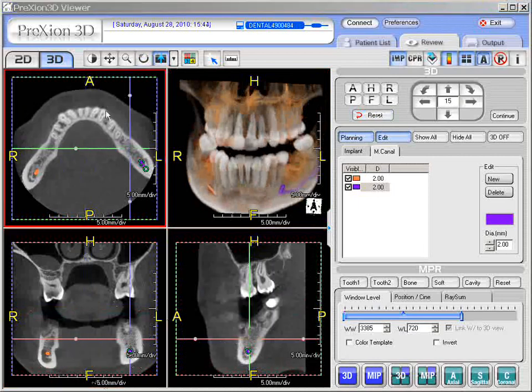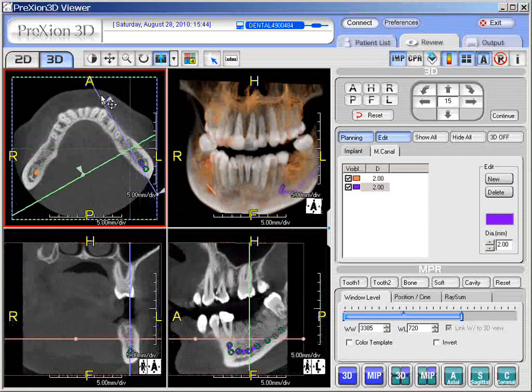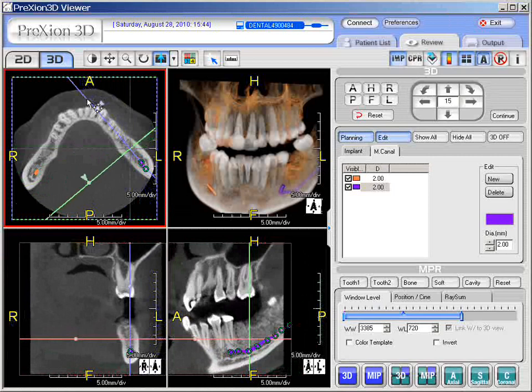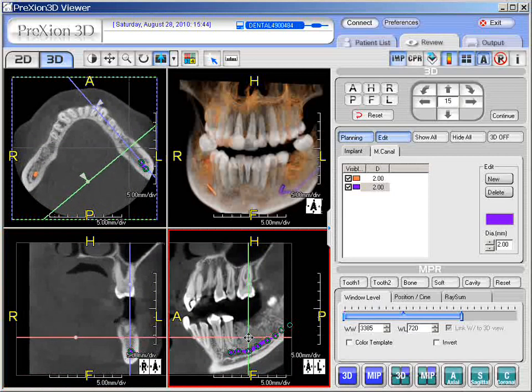And remember, go back up to the anchor point on the actual screen on the blue line, and you're going to rotate this line parallel to the level so that you can see a graduated, more elongated look here in the sagittal projection. And of course, you're more 90 degrees in the coronal view as well. So it's a very nice procedure function to get into where you want to measure. So let's say, for demonstration purposes, we want to put a little implant right in this section here. First thing, let's go and do some measurements.